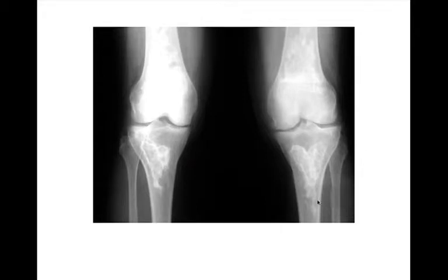Bone infarcts can occasionally mimic enchondroma, but if you see this kind of classic serpentine morphology, you can just really say these are bone infarcts and be done. This one is kind of a Valentine's Day infarct, a little heart shape there.